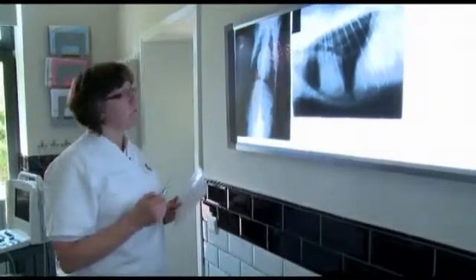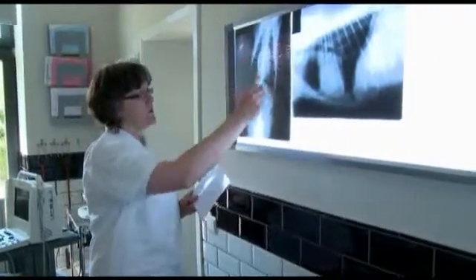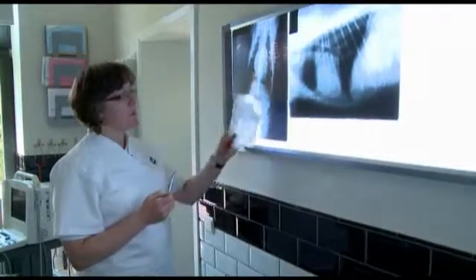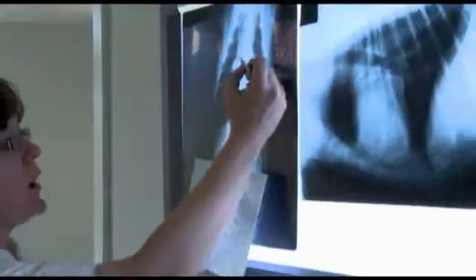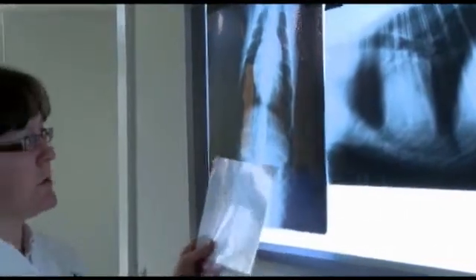Looking at the cardiac shadow first, on the dorsal-ventral radiograph, we have a typical reversed D shape. By using a clock, we can help in determining where the great structures, like the great arteries and the different chambers, should be positioned. From the 12 to 1 o'clock position, we have the typical bulge of the aorta. From the 1 to 2 o'clock position, we see one of the pulmonary arteries.